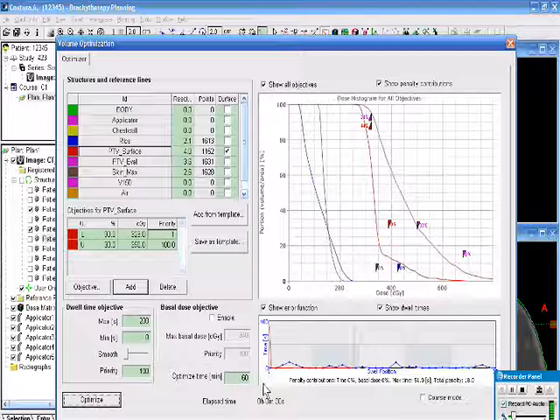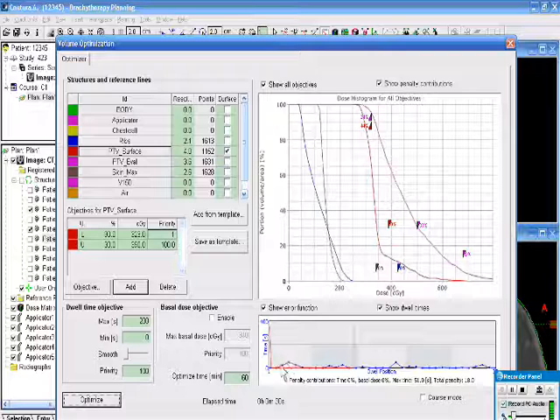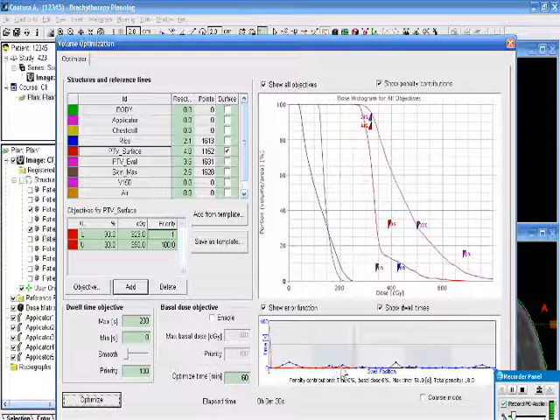See how long that took. Now we can also evaluate this right now to see this is channel 1, and it was sort of toward the skin and sort of posterior. And here are the dwell times. There are 3 of them that actually have positive dwell times. Right about in the center is where it's the most. Number 2, which was also toward the skin, but toward the head a little bit. 2 of them with actual dwell times.